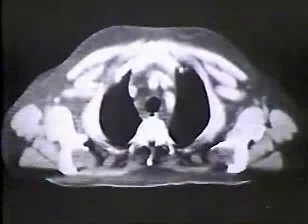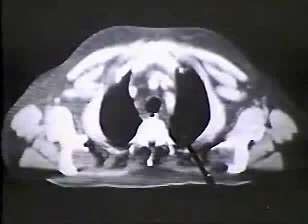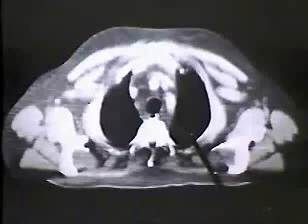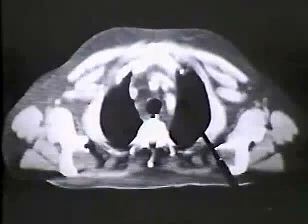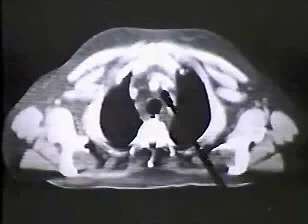Here is a typical CT scan in the same patient showing the 3 vessels. Now notice how large the subclavian artery looks. That may be because we are actually including a tiny little bit of the top of the aortic arch, which in the elderly is highest at this point. There also may be a slight dilatation of the subclavian artery just at its origin. Then we see the small common carotid artery, and we see the brachiocephalic artery here in the midline.